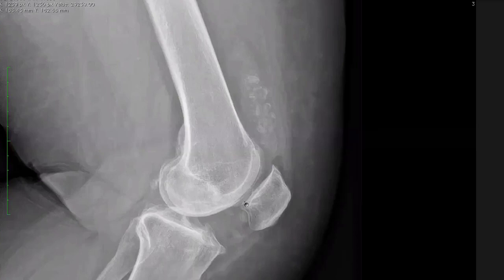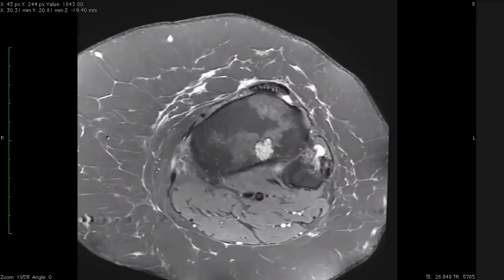Yeah. Okay. So in the context of moderate osteoarthritis, you're seeing these multiple bodies. So what's the diagnosis? We have seen one case at the very start that was primary. This is synovial chondromatosis. Synovial chondromatosis or synovial osteochondromatosis? Osteochondromatosis. Okay. All right. Let's go to the MR then.